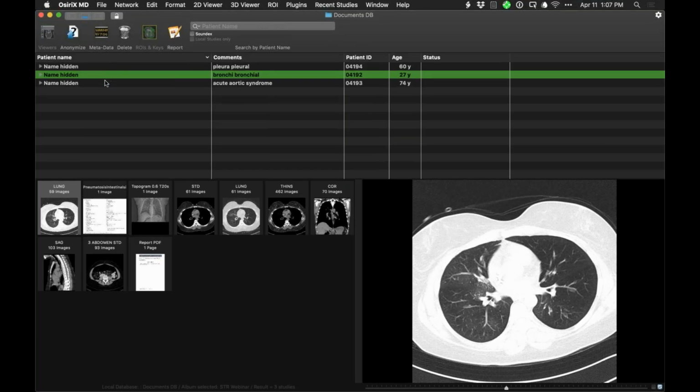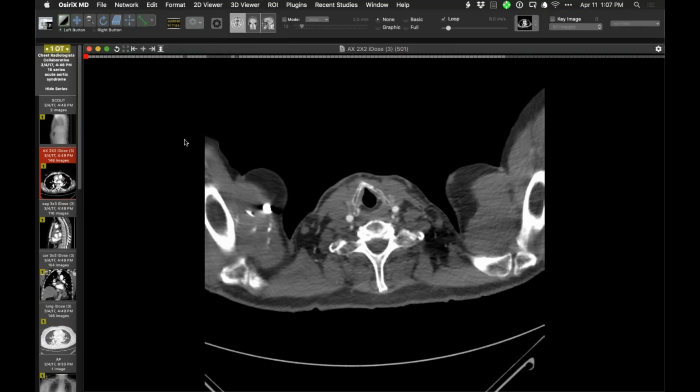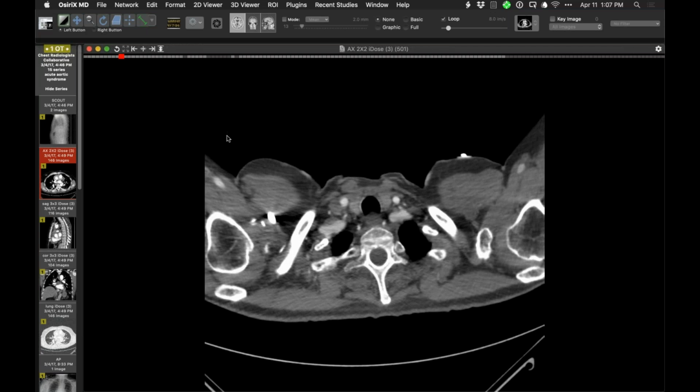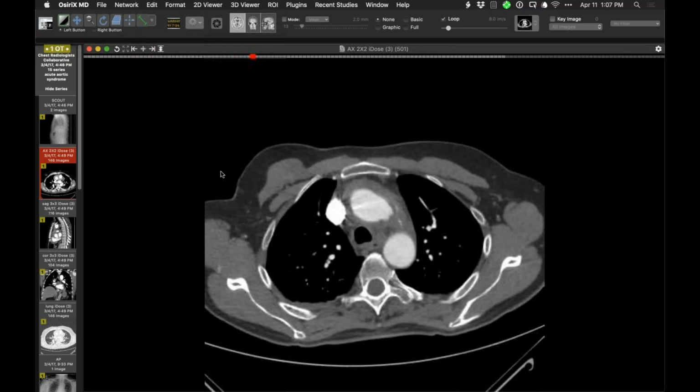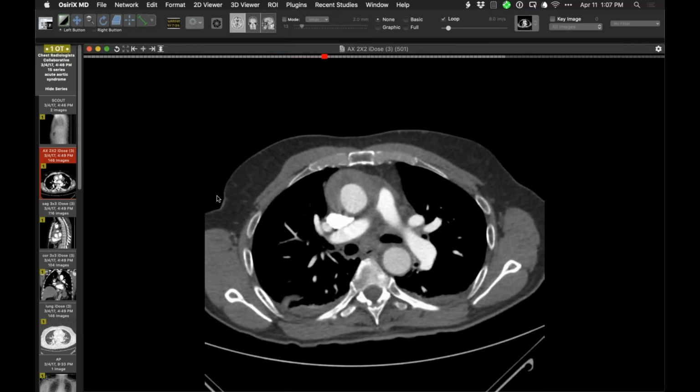The next one is this one. This one's interesting. I came across this the other day. The patient had surgical management of an acute aortic syndrome previously, I think I saw in follow-up. So I'll show you the images from the outside hospital. The patient was sent here with this CT.